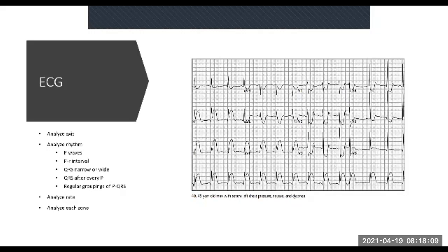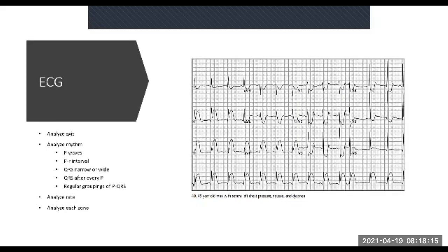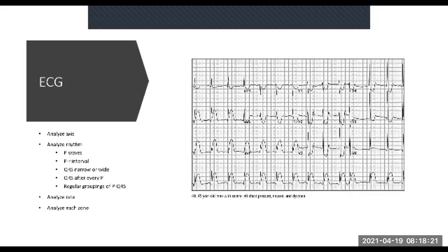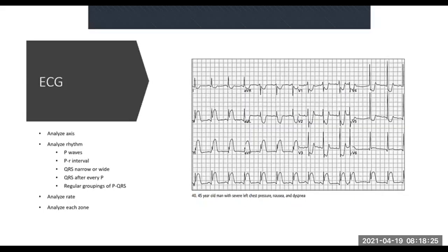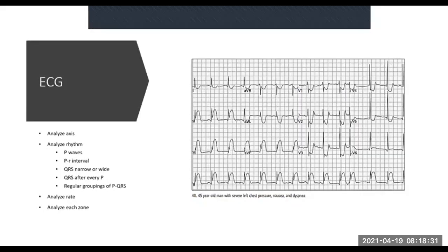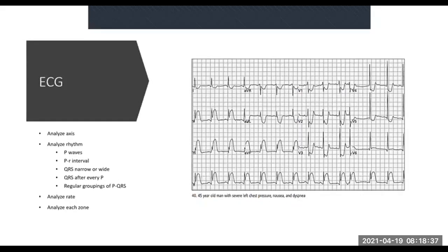All right. So I always put the slide up just so that you guys don't forget, right? To break things down into their little boxes, right? That you analyze axis, analyze rhythm, how you analyze the rate, how you analyze each zone, all right? So even something that looks a bit scary, does look a bit scary, I mean, there's a lot of things that are going on there, can easily be broken down.